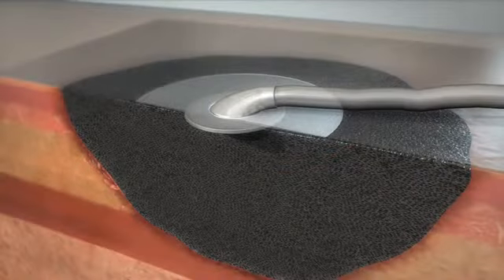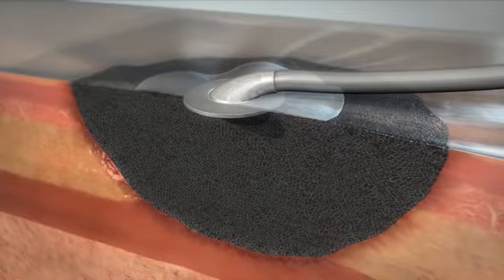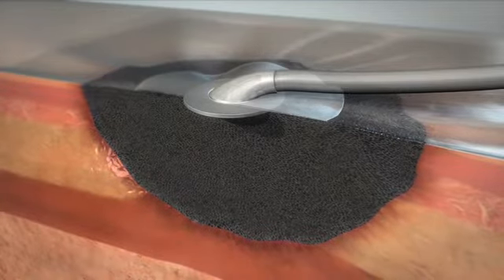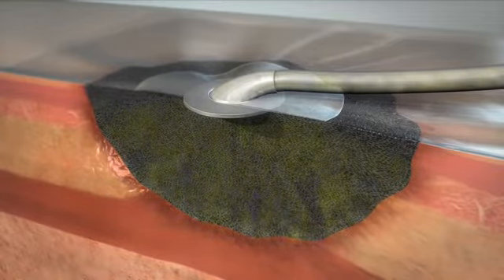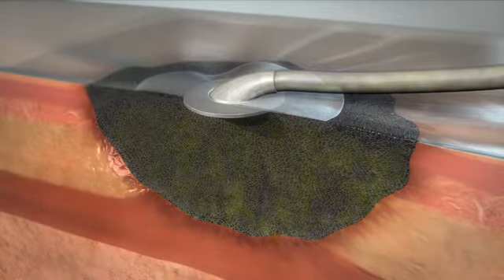The application of uniform negative pressure, when delivered by VAC therapy, induces a physical response, macrostrain, and a biological response, microstrain, that removes exudate and infectious material, reduces edema, and promotes perfusion and formation of granulation tissue.